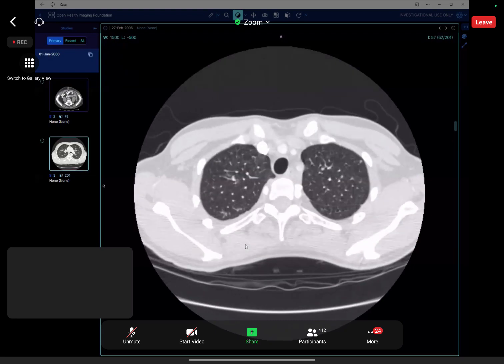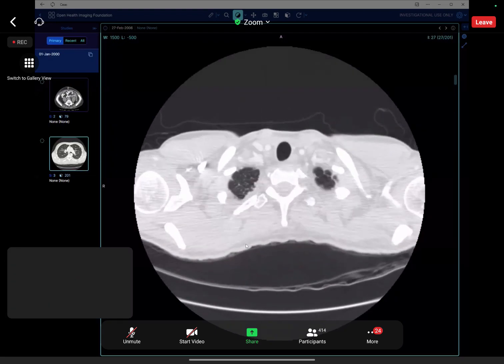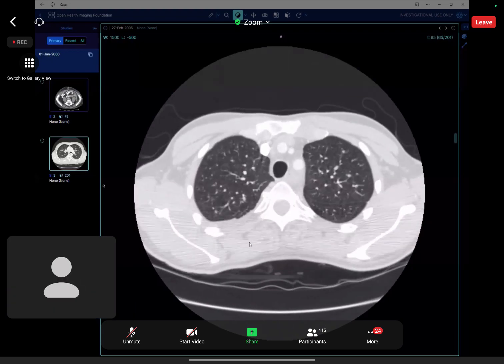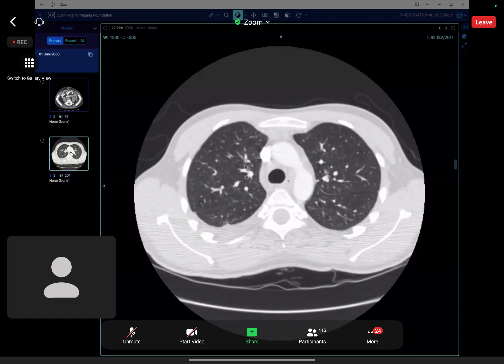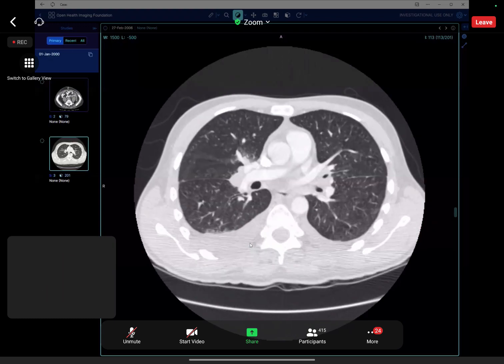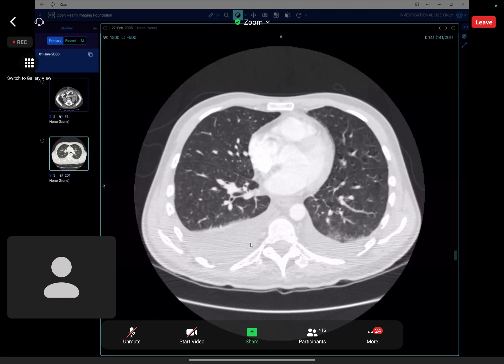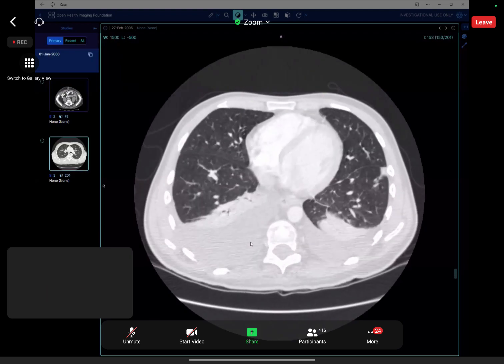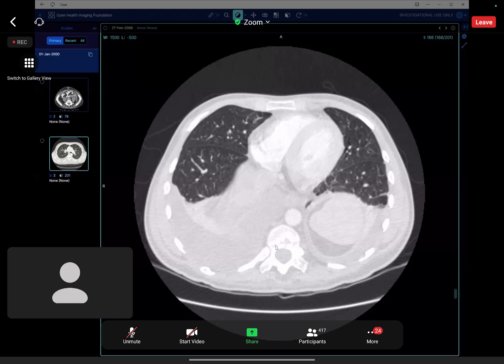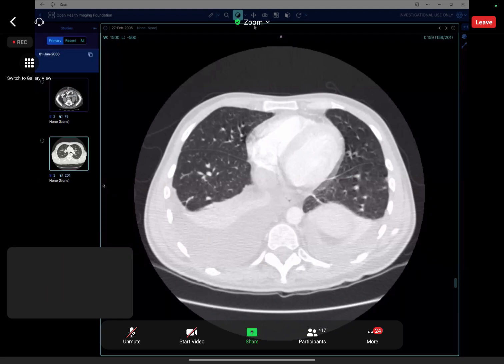These are the CT scan images in lung window of an unwell patient showing multiple lesions in both the lungs. There are bilateral pleural effusions, more on the right side. I would check the mediastinal and bone windows in the patient to see if there are any other findings.